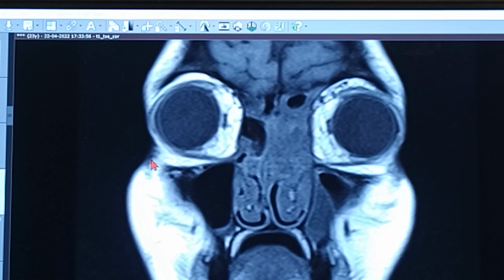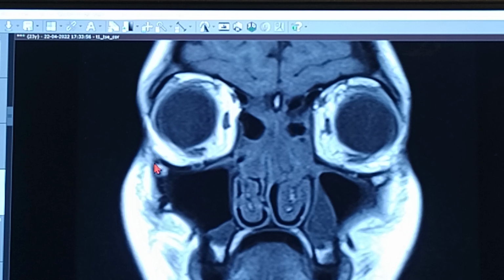The very first one is that I'm going to be teaching all the basics of MRI scan for this case, basically. Whenever there is any orbital invasion or intracranial invasion, how MRI can be useful, the basics of MRI, all the different sections of MRI, T1, T2 and T1 post-contrast, how one can identify all these different sections, what are the basic points in all these scans I'm going to be going through.